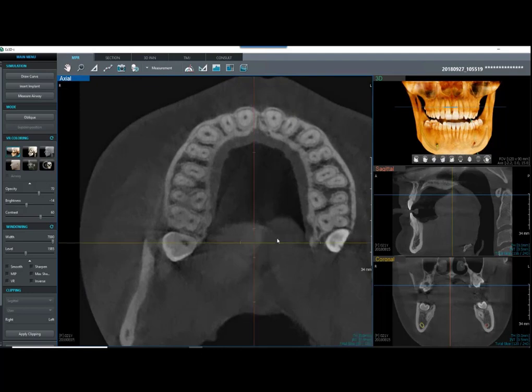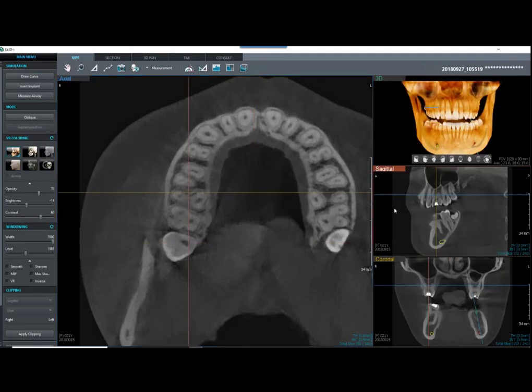Paul, an easy way to do that that you were talking about is just double clicking on here, and it's going to take all of our windows, all of our slices, axial, sagittal, and coronal, right to that tooth. I know you like using your sharpen, so let's sharpen that up, or maybe use our Mac sharpen. So we're applying some filters to that. And as I do that, if you look at our spotlight here, you can see our individual canals. I'm focusing right in here to look at that whenever I turn my sharpen on and off. Let's turn that off, turn that on. It does give us a little higher contrast or add some of those filters there. But also use our inverse tool here.